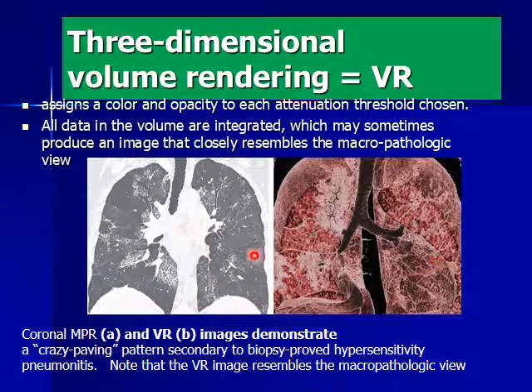So it can give a gross-pathology-like appearance. These images are very nice for the clinicians because they want to see what they see during gross pathology, during surgery and so on, but actually we don't use them for diagnosis. We can present the pathology, but we usually diagnose using the 2D images.